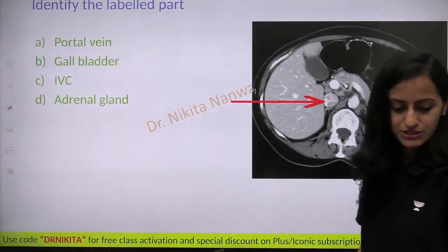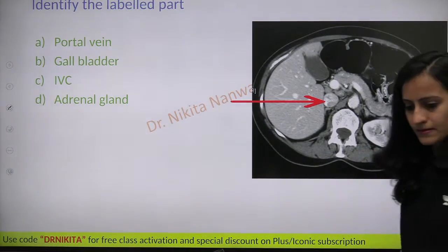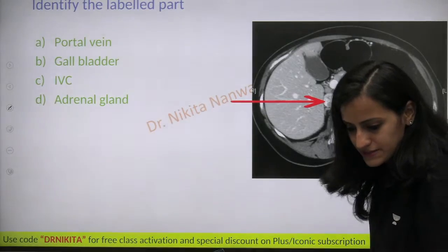The first question, identify the labeled part. What do you think is the labeled part here?